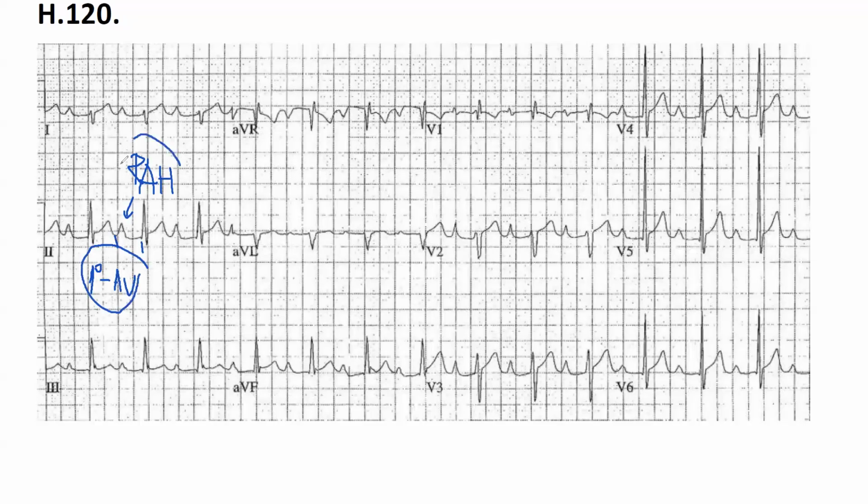Okay, good. Go on. QRS complex. They are narrow. Let's see it. Here it's starting and ending here. I will accept this as 0.1 or something like that, but it's borderline.